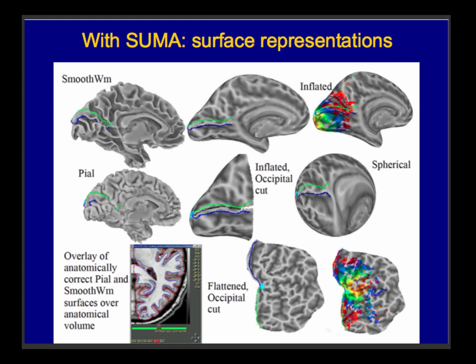And this allows us to not lose sight of information that's kind of buried in these sulcal canyons, but we can kind of project it out and see it all at once, throw information on there, see different types of surfaces. We can even look at a spherical projection, and a lot of times this is used for alignment purposes or intermediate steps. So all of these things are really the same data, topologically the same, just played around with geometrically.